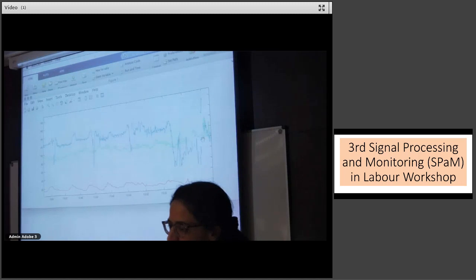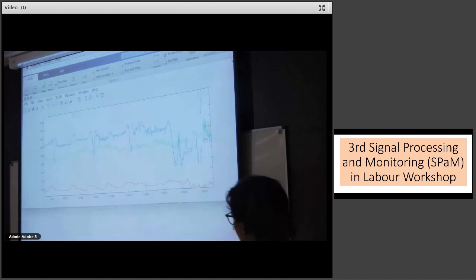That's a pretty long time to hold on a contraction. But I don't think the baby is troubled by it, because if he's troubled by it, something will happen to the baseline. But perhaps that's what we're witnessing at 15:58. What I'll be waiting for is to see if she's on oxytocin, you have too much. Yes, and it is one of those things that us clinicians miss out on.